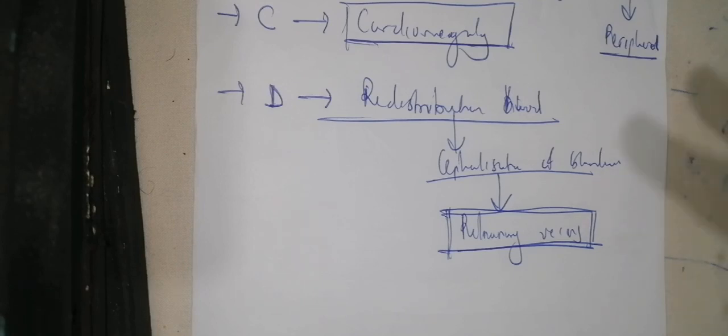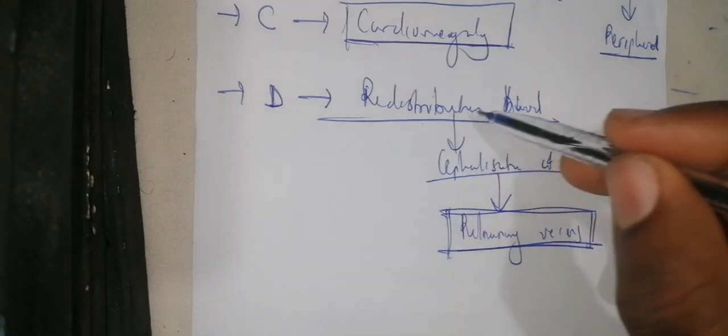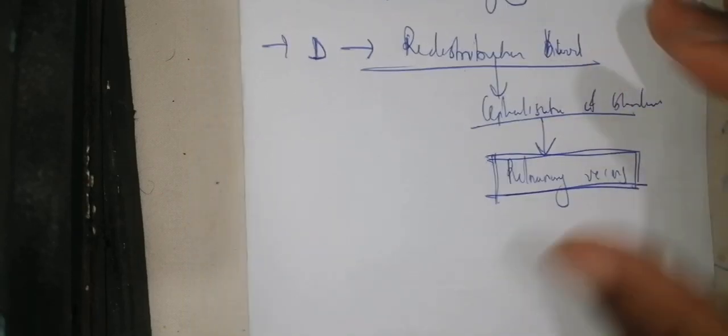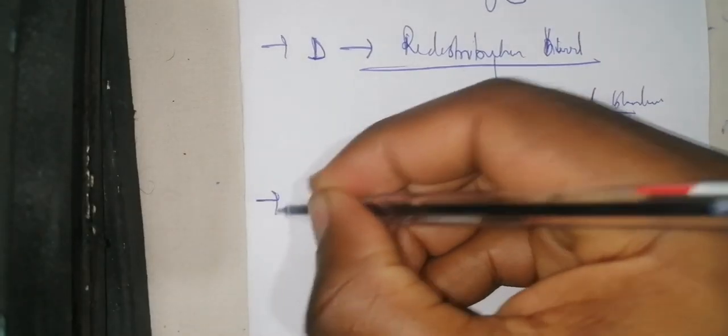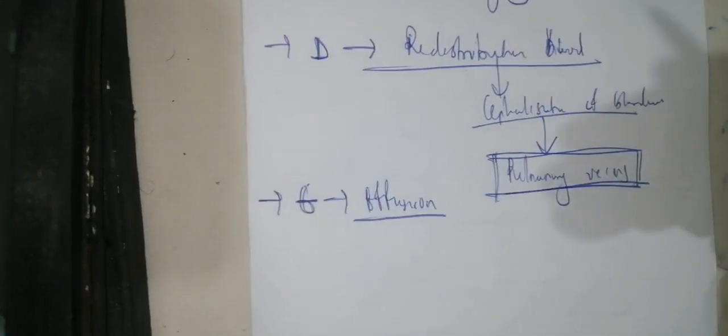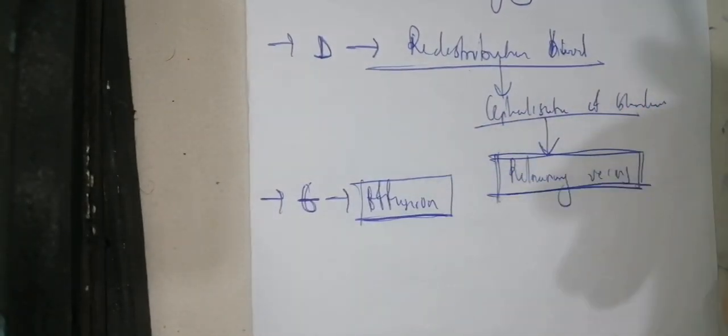Those are the different things that you have to understand. And this redistribution of blood vessels is particular to cardiogenic pulmonary edema. Now, the E aspect of pulmonary edema is when you have a pleural effusion. Effusion can also be associated with edema, and we are going to see it still on the X-ray as we continue with the terminology. So here we have now visualized the breathing, or the B aspect, when you are visualizing pathologic signs on the frontal view or the posterior anterior view of the chest X-ray.